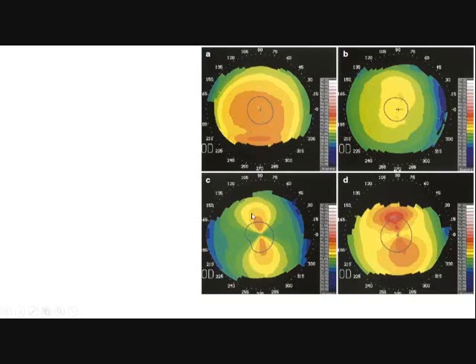What are the differences between the two? So you can say this is a regular one, the circular one. This is slightly oval. This is having a bow tie appearance. Here the bow tie is more asymmetrical, more red above and less red below. Here the brown is almost equal. So this is a symmetrical bow tie. So actually all these are normal corneas. These are the different shapes by which normal cornea is represented in topographic maps.